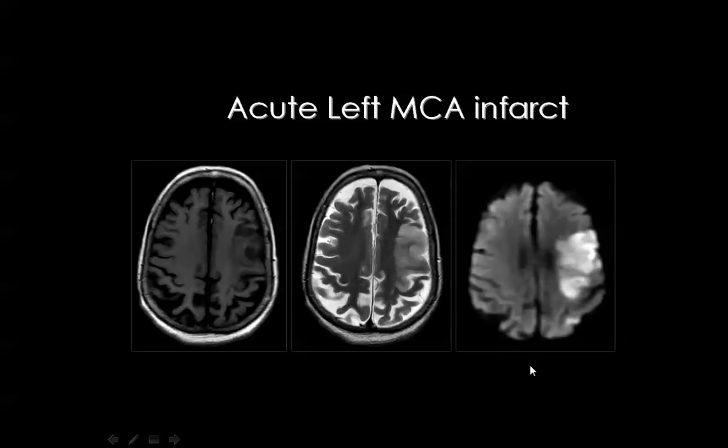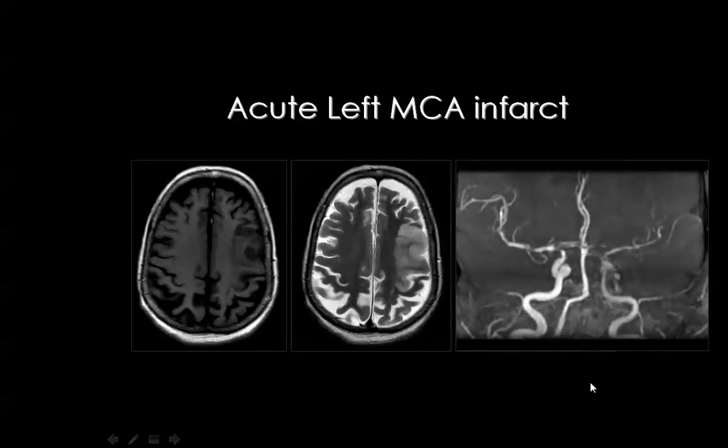And we'll discuss this in detail after that, but for the current time, you should know that the acute infarction will show restricted diffusion in the diffusion weighted MR images, meaning that whenever the CSF is black, the infarcted area will appear bright, and this means restriction of the diffusion in this particular area. And you can easily appreciate the good delineation of the infarcted area by the diffusion weighted images compared to the T1 and the T2 weighted image.